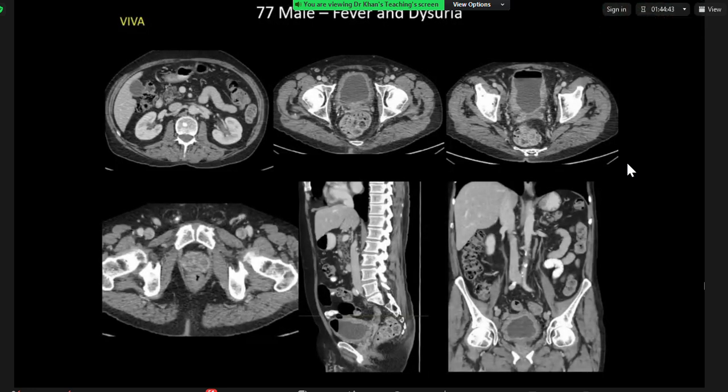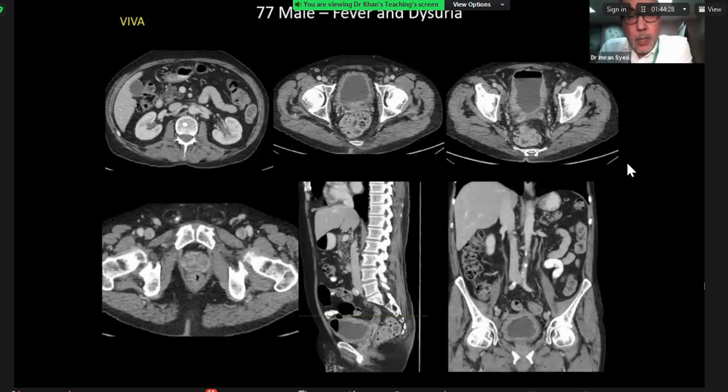Within the prostate itself, there are punctate areas of low signal and peripheral enhancement. Yeah, so there is heterogeneity of enhancement. Perhaps we can't draw too many conclusions. Sometimes we can with the CT. But on this occasion, there appears to be an involvement of the prostate, at the very least. There may well be a prostatic abscess here that you can see just at this point.